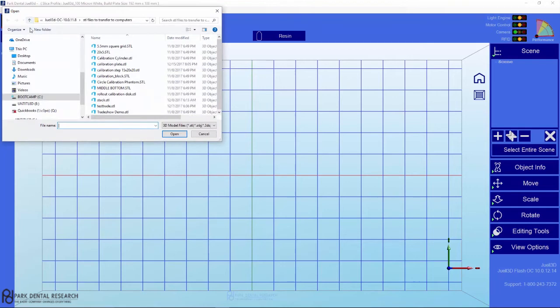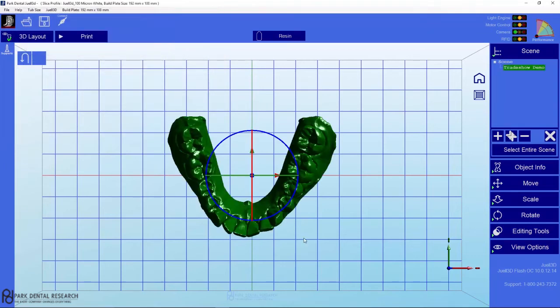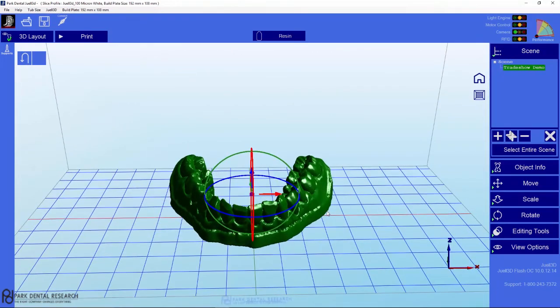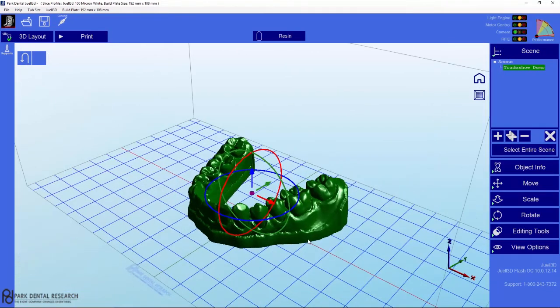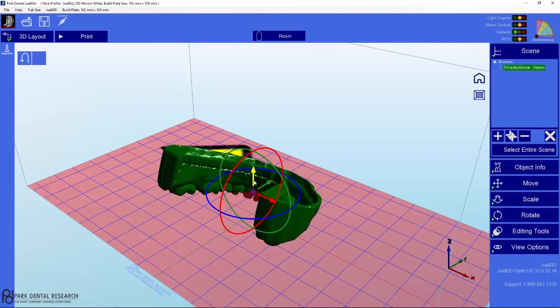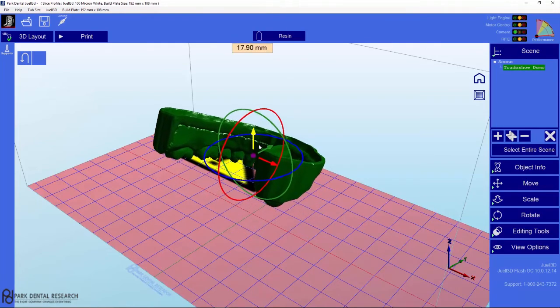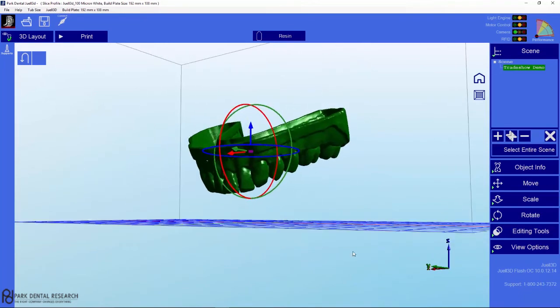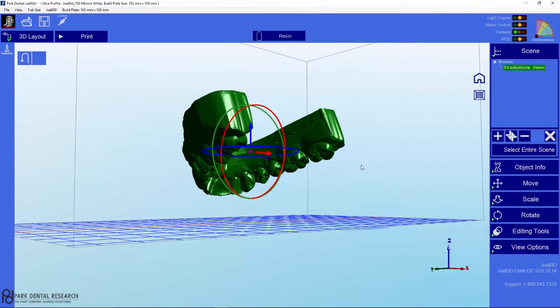First, let's bring a model onto the build plate. And this first model would normally be built in a position laying it flat on the build plate. But let's assume for a second that we have something that has a different shape. Maybe it's a surgical guide, maybe it's a dental crown, or some other object that has downward facing areas of the model.